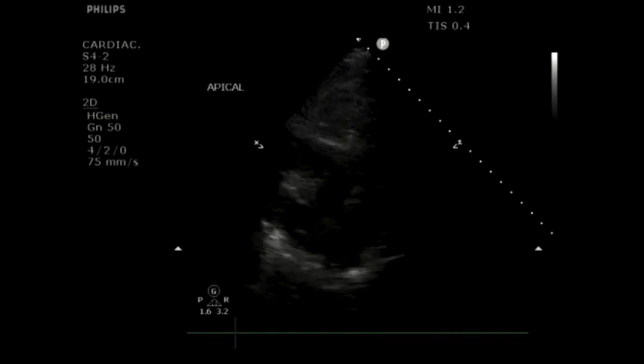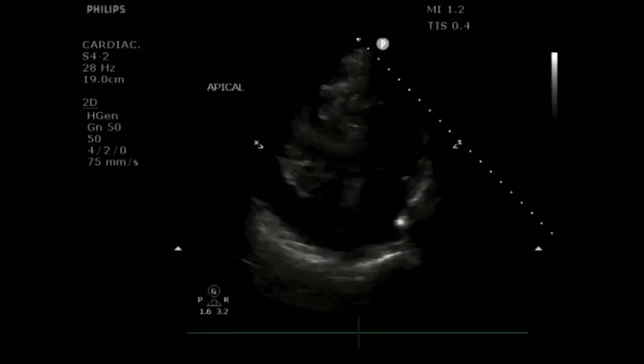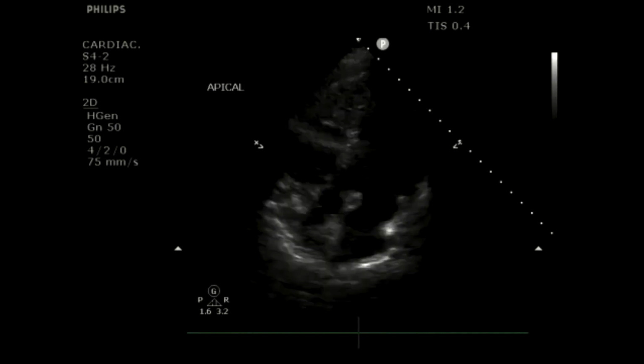And kind of how this can be used in the ED to understand the physiology of what's going on with the PE, and then assess our patients to help us move the diagnostic ball forward, right? So with that being said, I'm going to show just some pictures of a case that we had not too terribly long ago that are getting at that 60-60 sign. So Ashish, here's this patient, I think had a saddle embolus, if I remember correctly.